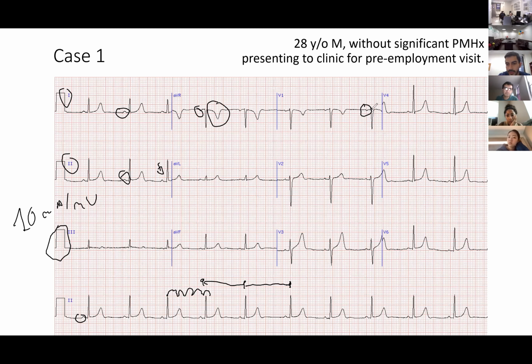Then otherwise you can state right away that there are no signs of atrial enlargement based on what I told you. Then you want to see that the PR interval lands in between 120 and 200 milliseconds, meaning 3 small boxes to 5 small boxes, which is the case, right? It's around 3 to 4 boxes, so it's a normal PR, and it's constant, right? So it's part of that I was telling you to say that the rhythm is completely normal.